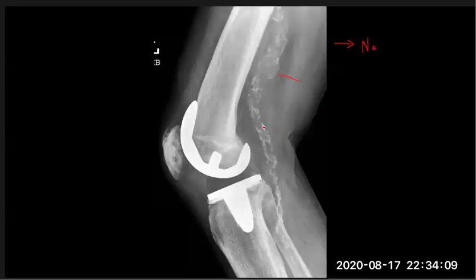And you see here, the lumen looks okay. It is not narrowed. So the calcification is not in the lumen. Where is the calcification? Adventitia layer? Adventitia and media.